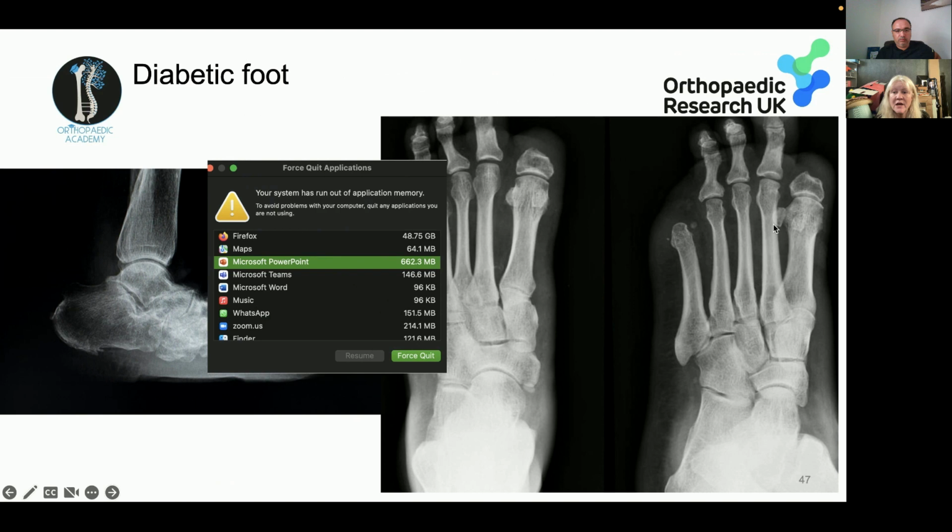Okay. And the last question, if we can, we've got a foot x-ray. There you go. Does it show fragmentation, dislocations, osteolysis, fractures, or all of the above? So this x-ray is 42% got the correct answer. It's showing all of the above.